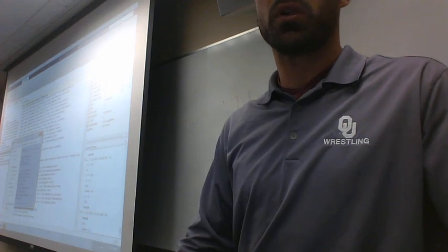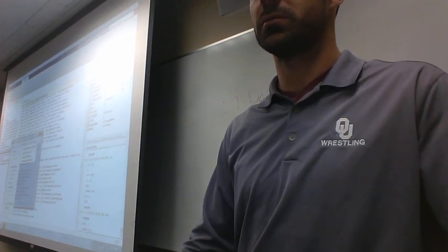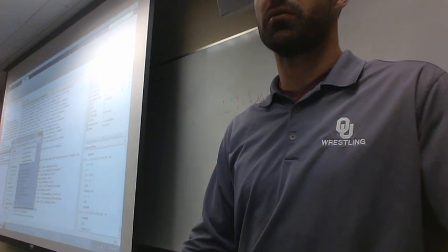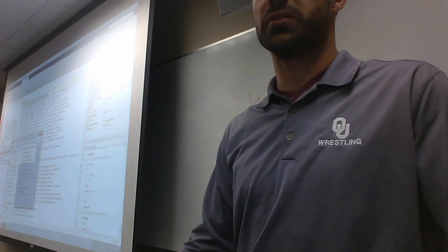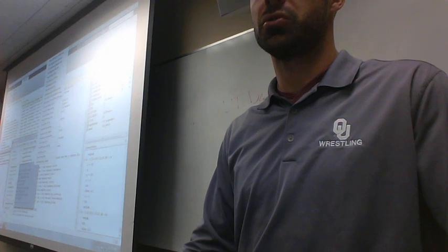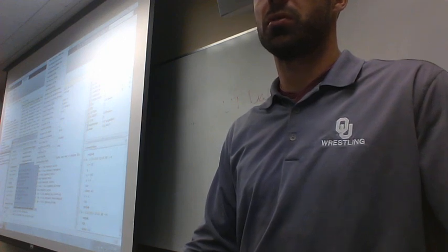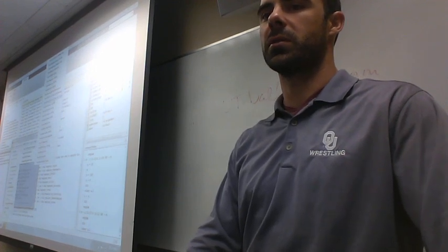What we can do is import data. Everybody hover over here. You see this little thing? We're going to use the BioSig interface. Let's do BioSemi BDF and EDF.